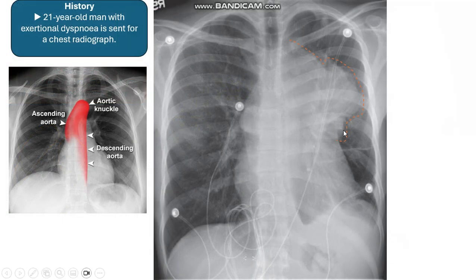So how to detect the retrosternal space and its abnormality, and what are the three specific criteria of anterior mediastinal masses.